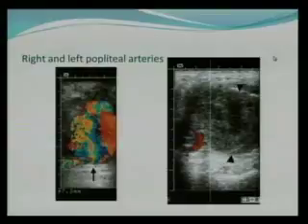So the first ultrasound that we see over here is, I don't have a pointer. I don't know if this is a pointer. This one? Or drawer? This is a pointer? Yes, this is a pointer. Oh, okay, thank you. There's a pointer too. Thank you, Dr. D.